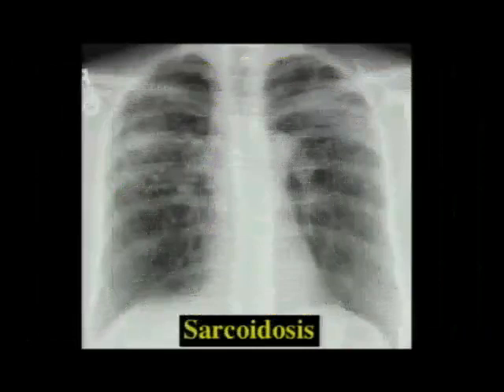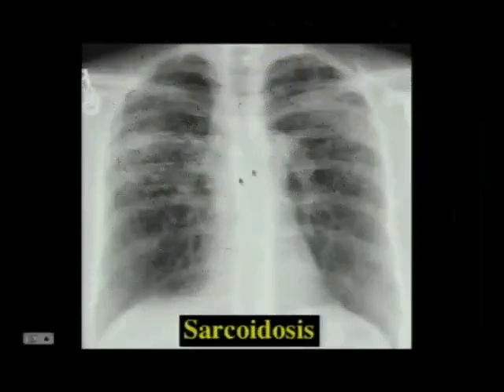Now this, of course, is the appearance of sarcoid on a chest radiograph. What we see is a predominance of nodules in the upper lobes, and in this patient who has some lung fibrosis, the pulmonary hila appear elevated, quite common in patients with sarcoid.